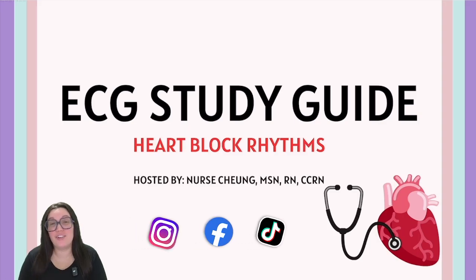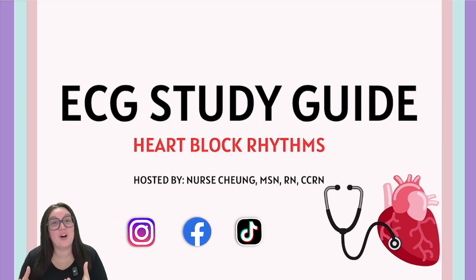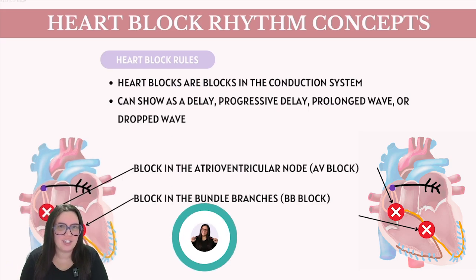Heart blocks. You either love them or you hate them. That's exactly what we're going to be talking about today in our ECG concept series. We're going to be talking about all the different kinds of heart blocks. Let's get started. So we're going to begin with heart block rhythm concepts. What specifically do we need to know about these?